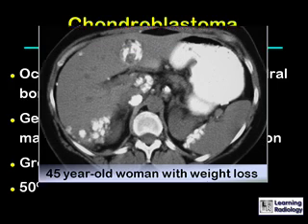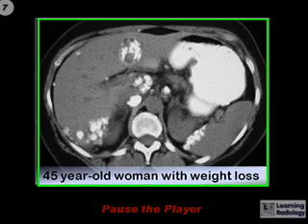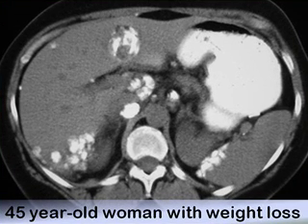This next case is a CT that is performed with oral but not intravenous contrast. It's a 45-year-old woman with weight loss. Pause the player.